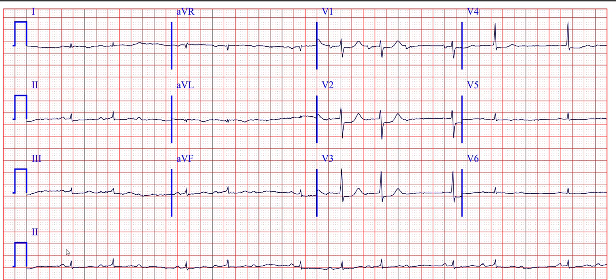If you are familiar with the basics of ECG, you can identify it, right? And here also you can see again a P with QRS dropped, and this is the PR interval. Here the PR is again prolonged, here again P is dropped, QRS is dropped, so again 3 is to 2 Wenckebach phenomenon.